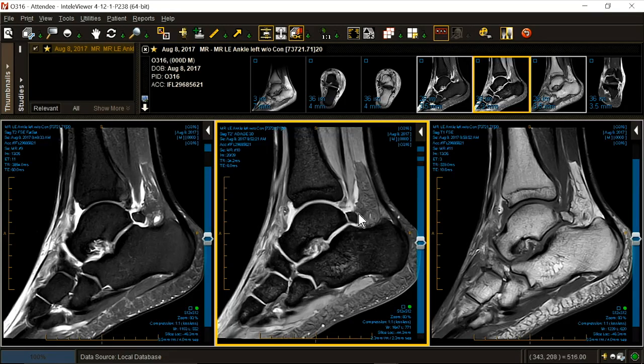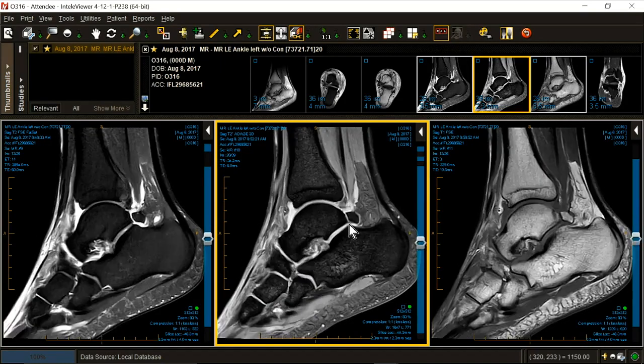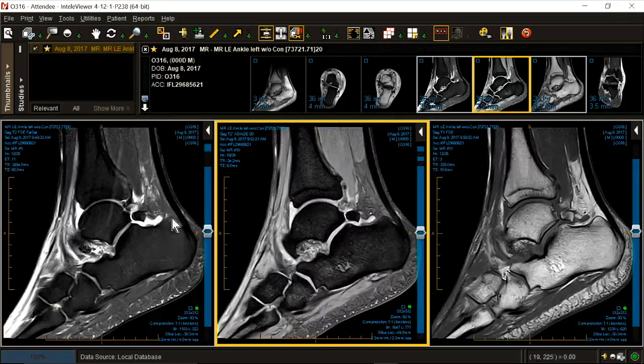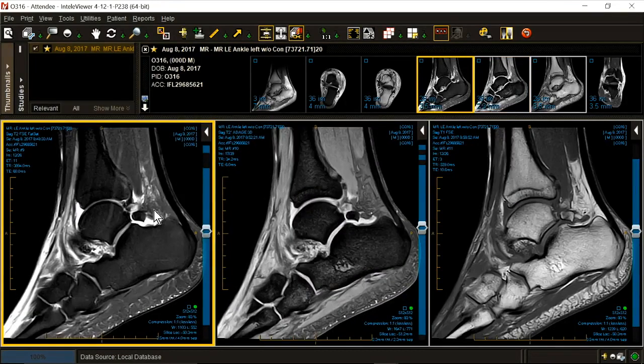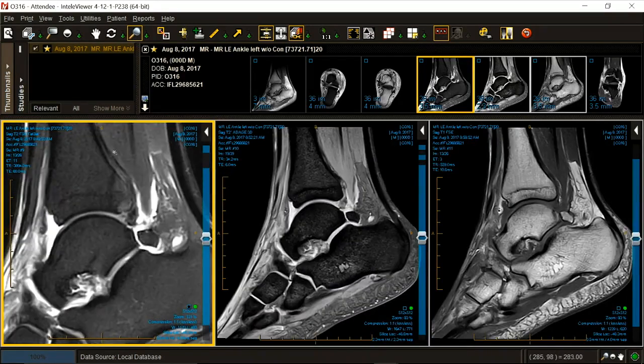He's got a large os trigonum, or old Shepherd's fracture. He has a little subtle swollen area along the posterior malleolus with periosteal elevation, just as you might see had he been a juvenile with a low-grade Salter-Harris 1 injury.